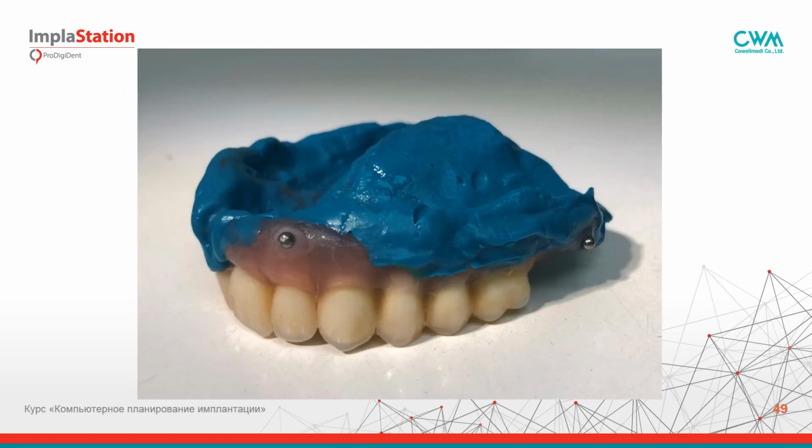This is an example of how to modify an existing denture for these needs. First, as you see, the doctor made a rebasement of this denture to have more actual information about the gingival surface.